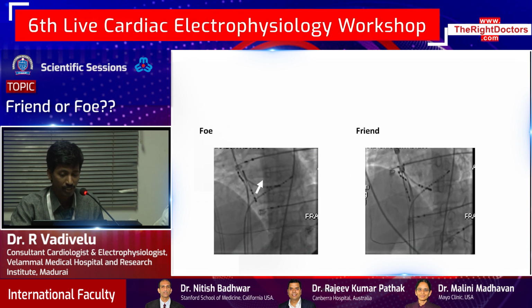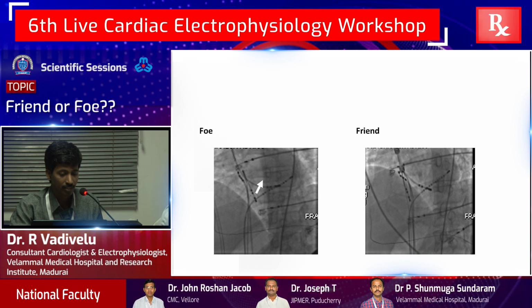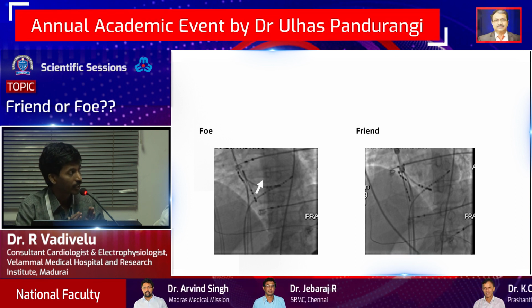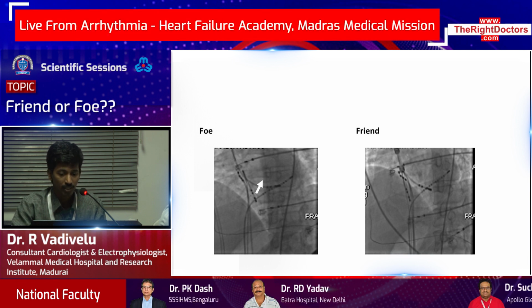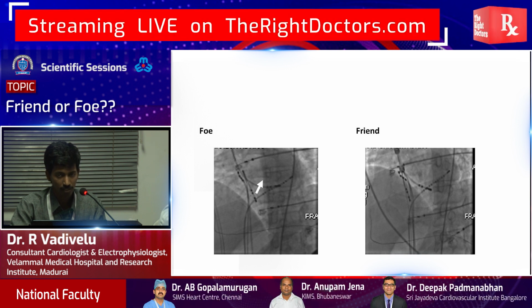And when the catheter tip is here, this is the AV signal, and this is the unablated site. I did atrial pacing, where I showed the gap between this and the His is around 33 milliseconds. So it was very close. Just above here the signal was this, and just below here. So what I am concluding is that this is the left bundle branch potential. If I would have ablated somewhere here, I might have landed in complete AV block.